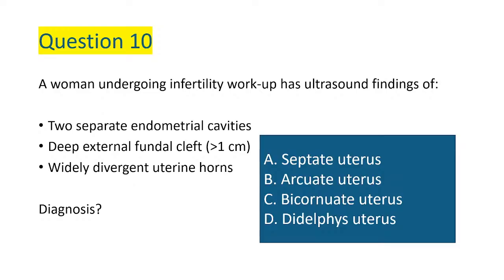In this case, you can team up as groups, or you can be individuals. I need you to come up with the diagnosis. Write in the comment section, let's discuss in the comment section on our YouTube channel. Let's exhaust it there. This is consistent with a bicornuate uterus.